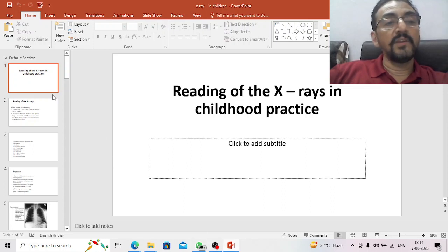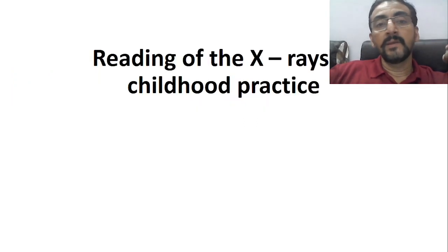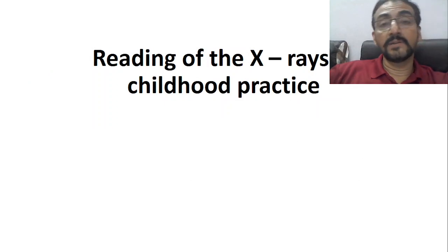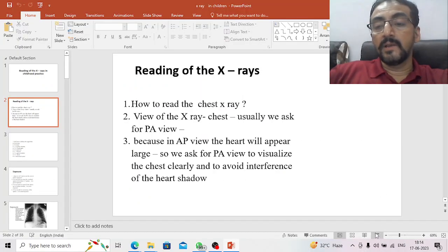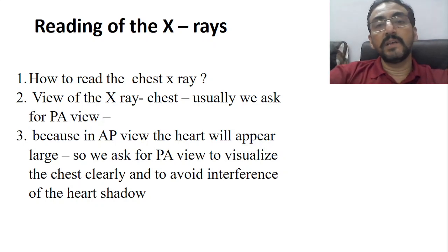So today we will see some of the basic rules and understanding regarding how to read the X-rays in childhood clinical practice. In childhood clinical practice, knowing about the X-rays is very important. And before going to the details of the disease-wise, first we will see what are some of the common rules that you should know when we are dealing with the X-rays. The question is how to read the chest X-ray.